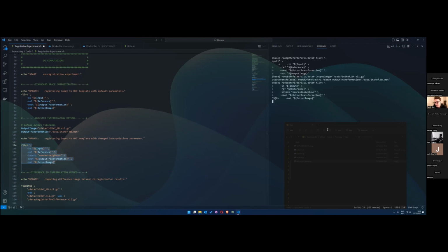The interpolation now is not going to create new intensity values anymore to make it fit, but rather it's going to use intensity values that are already present in the image. So the nearest neighboring voxel, the one that is closest to it, will then be used to make up the new voxel. So it's a little bit more of a clustering of already existing intensity values, as opposed to creating these new intensity values based on the trilinear interpolation that was the default that we used for Flirt.